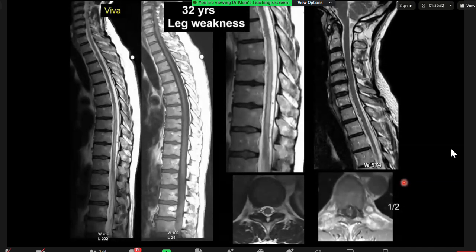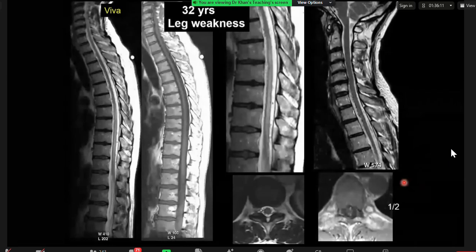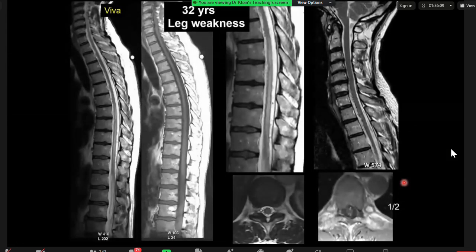anterior aspect of the cord, especially in the cervical region, appears a bit irregular. And this is also seen in the T1 weighted sequence. In the close-up view, you can see low signal intensity projected over the CSF. These appear to be vascular, and this is on the axial images.